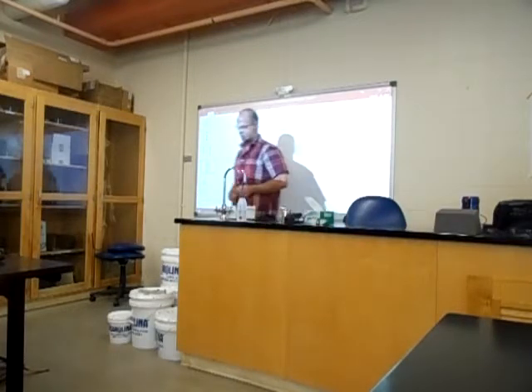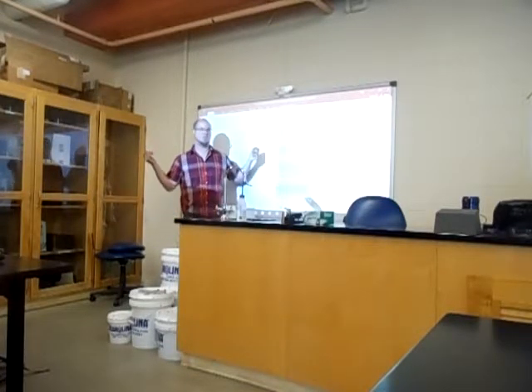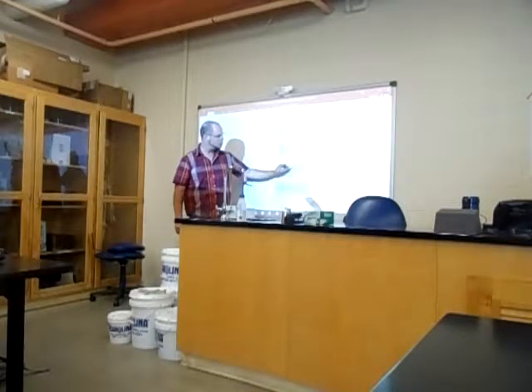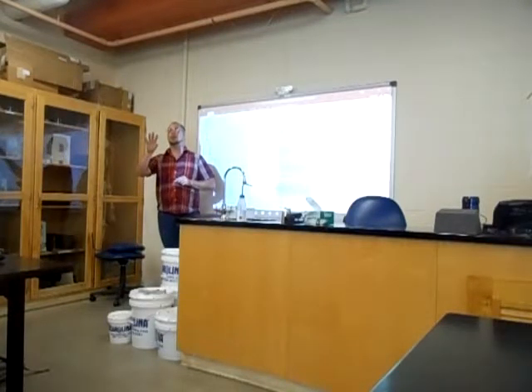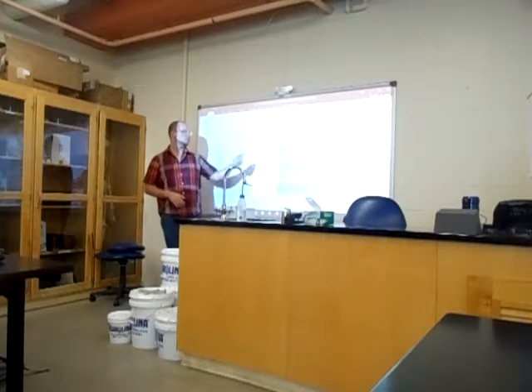Now I called this a partial heart block because if you'll notice, sometimes we've got P wave, QRS complex, T wave. That's fine. And it starts over with a P wave and then nothing, right? And the heart tries again. P wave, QRS complex, T wave. Again, a normal one, and then a failed one. Okay? So what we're seeing here is approximately 50% of the SA node signals are not making it through. That would be a partial heart block.